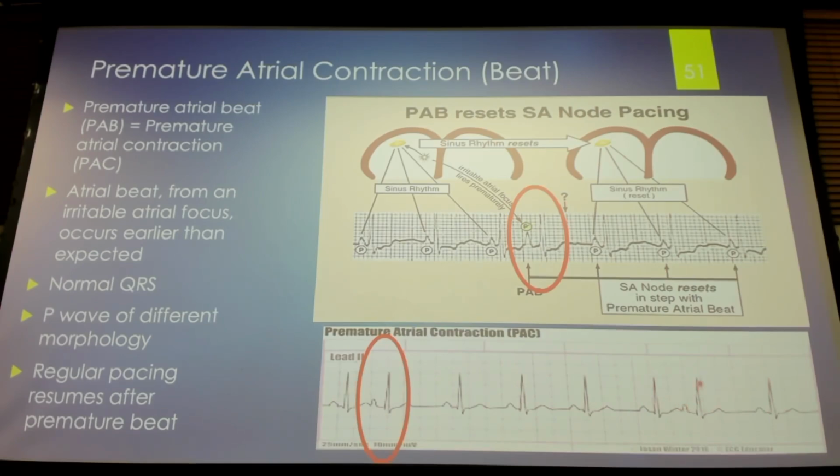And again, if you look from here to here, you can tell this is a little bit longer, but if you were to march these out, put your tick mark here, your tick mark here, march it out, this right here is falling right in line with where it should be. Normally this would be right over here, and then this is falling right in line as the SA node resumes pacing for this patient.